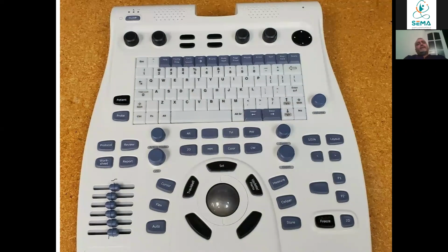We should know how to operate the machine, because if you don't know how to operate it, sometimes you will be in a critical situation. First of all, the upper stage where there is the off and on. Usually we press and keep pressing until the green light comes.